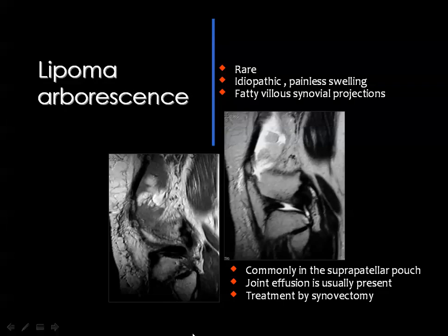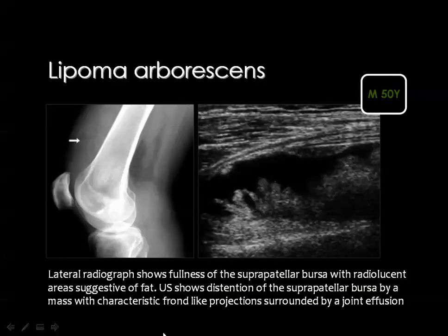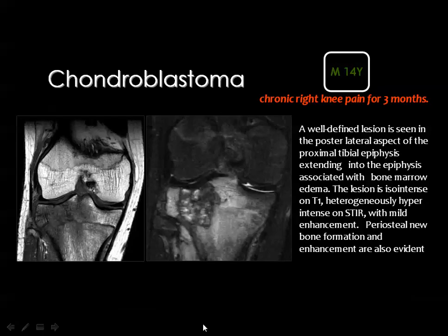Also, you have heard about the lipoma arborescens when I discussed the knee joint. And this is MRI T1 sagittal of the knee and T2. You got synovial fluid with intrasynovial branching fat signal mass, and this is known as synovial lipoma arborescens. And you remember the difference between synovial lipoma and lipoma arborescens. Lipoma is just a mass, while arborescens is a branching fat-containing lesion within the synovium.